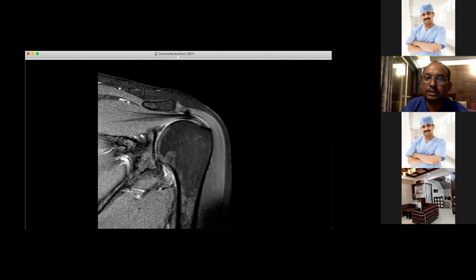That's why in this area we do get an abnormal signal. We should always see this signal in other sequences to rule out completely whether there is a pathology or not. But many a times, people do report it as tendinosis or tear, but actually it is not. It is a magic angle phenomenon, which is a normal looking tendon. So the tendon should look dark. The bones are looking darker here. The fluid will be looking bright. If there is any joint effusion, it will be seen brighter over here, in any of the joints.